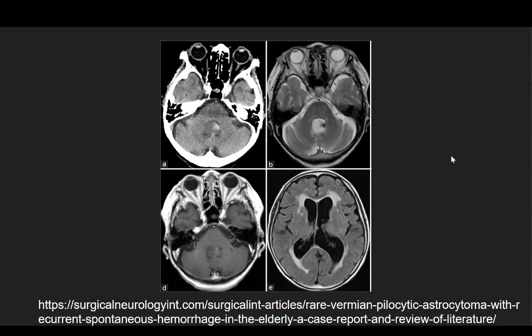That is the catch. It's not a ventricular lesion. We don't see a ventricle here. What you're seeing here is a cystic component and a solid component. Let me mark this. I think the ventricle is pushed away to the left side. Is that correct? Yeah. This is where the ventricle is, right? It's very slit-like. Yeah. This one is the ventricle. So this is not an intraventricular lesion. Where is it?